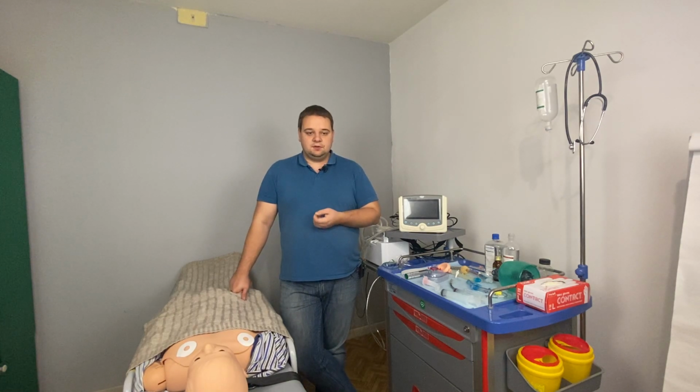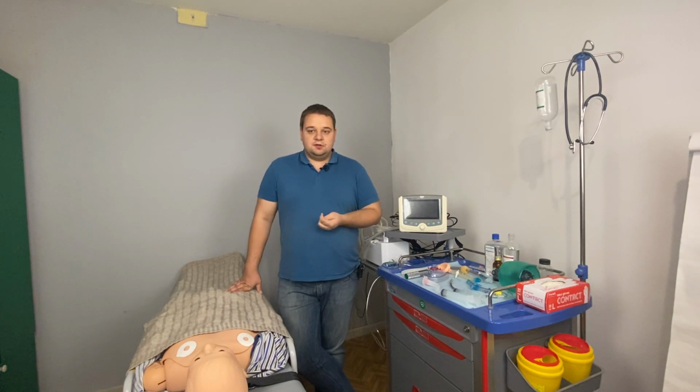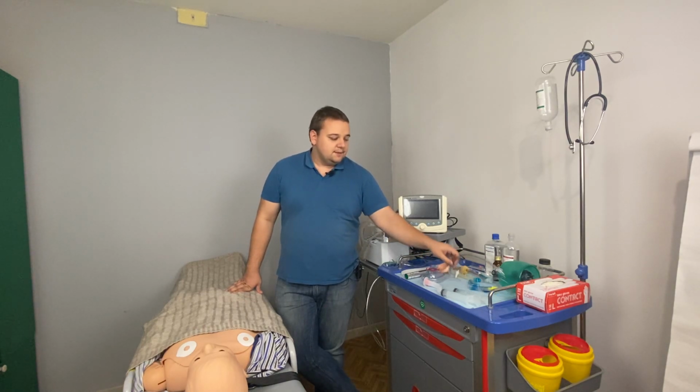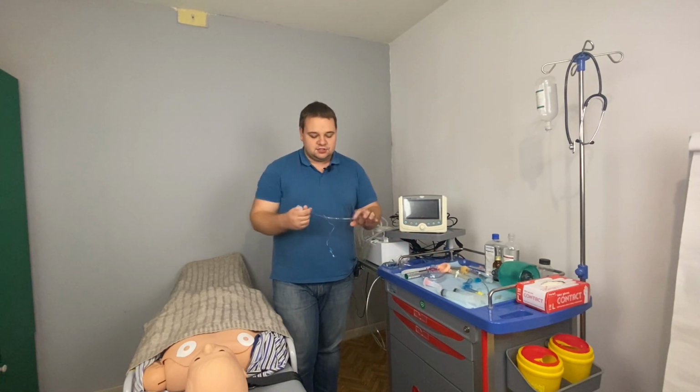If a small amount is inhaled into the airway, aspiration pneumonia may develop due to the inflammatory reaction to these foreign objects. This is not enough to cause the death of the patient, but of course it's bad, it leads to complications which need to be treated. And in some cases, these complications may be fatal if the condition of the patient worsens due to the development of this pneumonia. So, to deal with these processes, scientific teams and rescue teams started to use intubation tubes to completely seal off the airway from the outside and from the contents of the stomach.